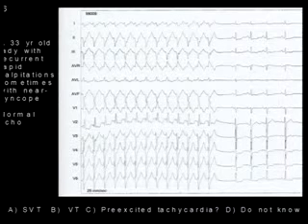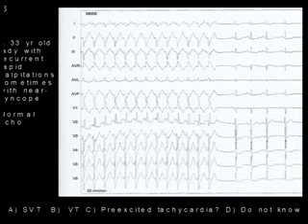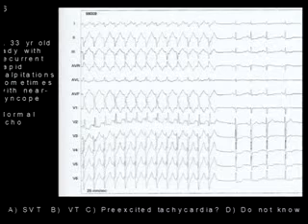So the initial activation is very sharp and the late activation is slow, whereas in the Brugada criteria and all the other criteria, what we're looking for is slow initial activation. This is one of those that can fool you because initial activation is Purkinje. It is rapid, it is sharp, and it is the opposite of what we find with most morphologic criteria.